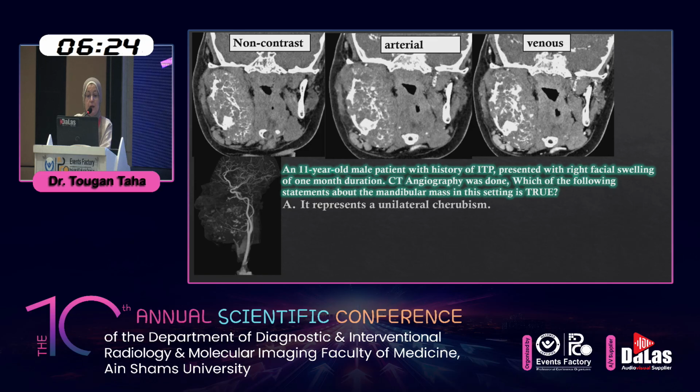My last case is an 11-year-old male patient with a history of ITP, idiopathic thrombocytopenic purpura, who presented with right facial swelling of 1 month's duration. CT angiography was done. Which of the following statements about the mandibular mass in this setting is true?